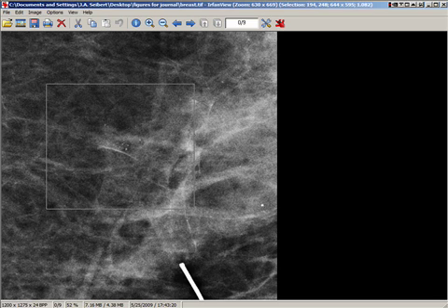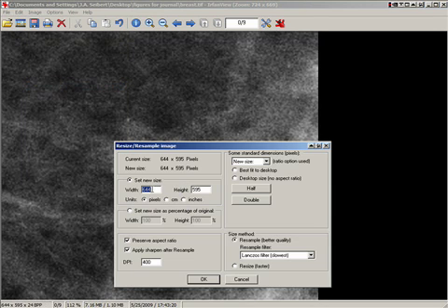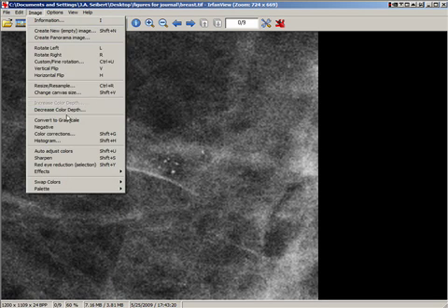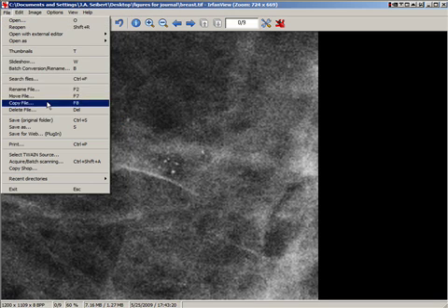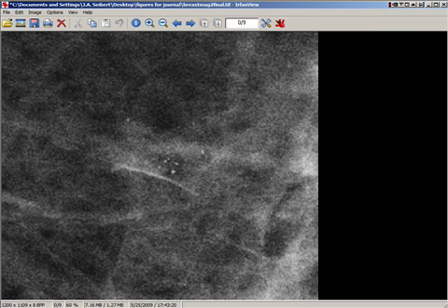So now I really want to go ahead and expand out, so I'll do an Edit Crop and Image Resize, and the resizing will be at 400 dpi, and I want to resize that also to a 3-inch width. Notice that it converts to 24 bits per pixel. I can do a convert to grayscale, File, Save As, and we'll save this as breast mag 2 final. And save. We're done, but now we have to verify using the word processing program.